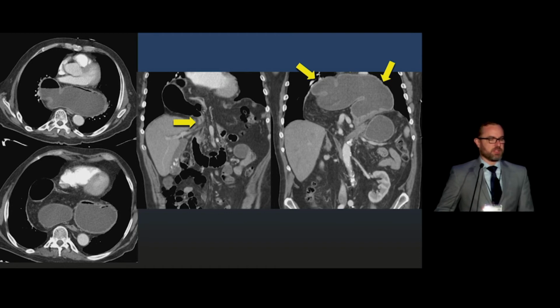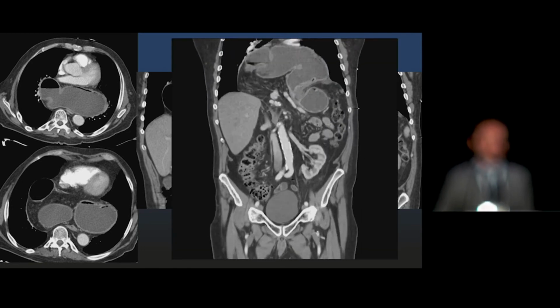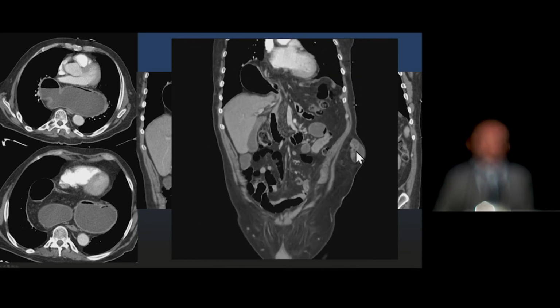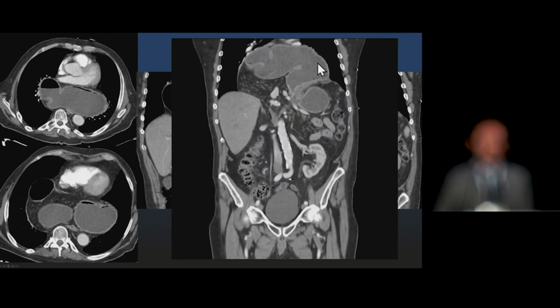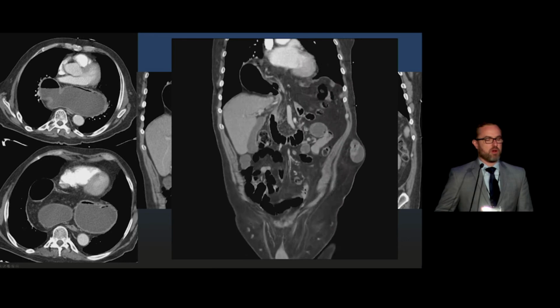Here's another distended stomach, but not the same anatomy. This patient has an intrathoracic stomach that is distended. There's a transition point near the hernia neck, and there's an organoaxial or flipped rotation of the stomach in this patient with a clear case of gastric volvulus, perhaps easier to appreciate on this cine image, which again demonstrates decompression of the obstructed stomach at the hernia neck and an abnormal lie of the greater curvature of the stomach above the GE junction.